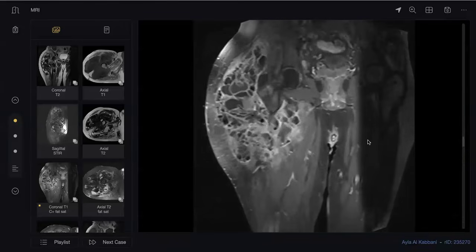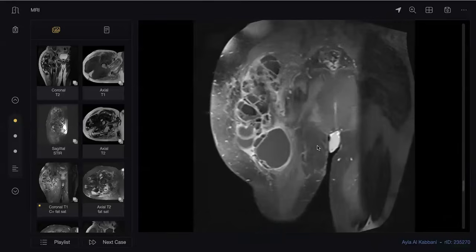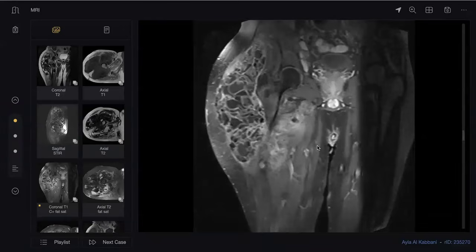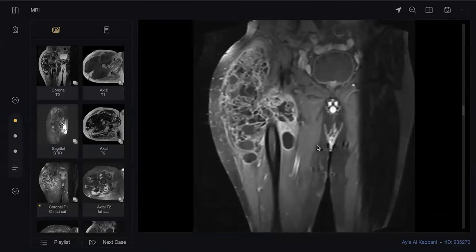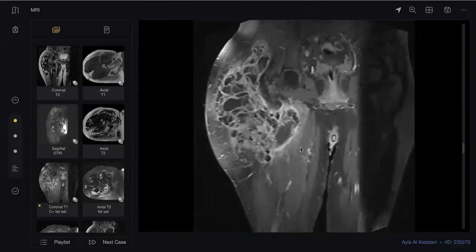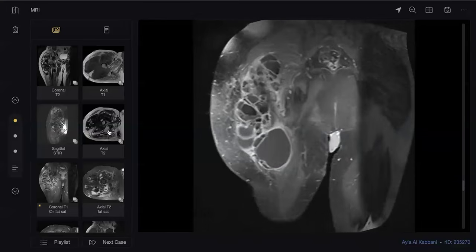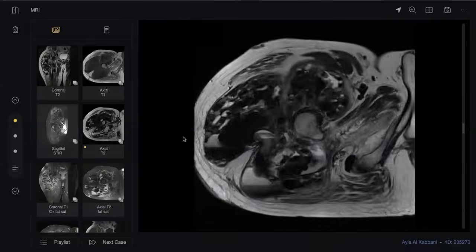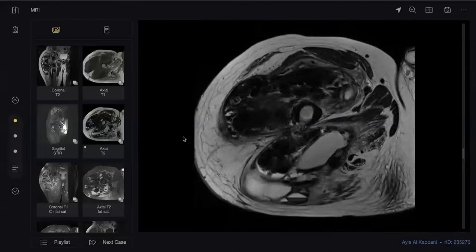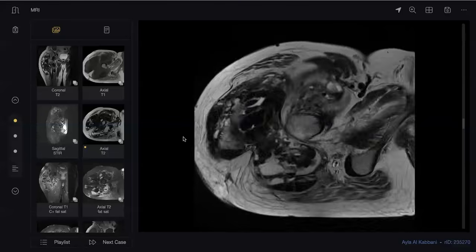The lesion also contains calcification. I would also like to check if there is any previous radiograph. First of all, you tell me what these sediments are. You told me these are calcium, but is this milk of calcium or maybe fibrosis?